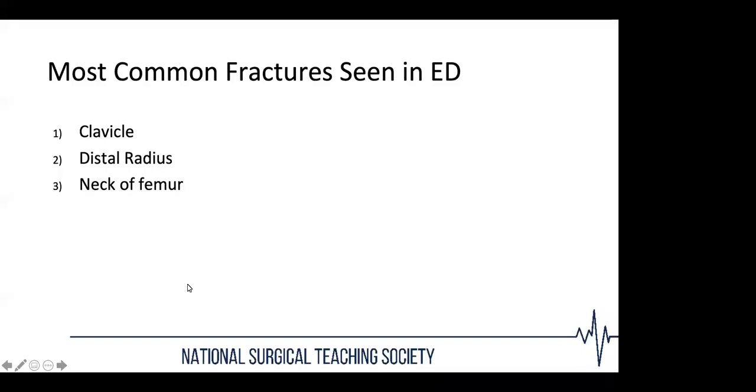So we've gone through the ABCS approach on how to review appendicular films. So once again, it's alignment and joint space, bony texture, the cortex, and review of soft tissues. We're now going to go through some cases. Obviously, there isn't enough time to go through all of the joints, but I thought I would cover the main ones that you should expect to see as a junior doctor, either on the wards or on call.